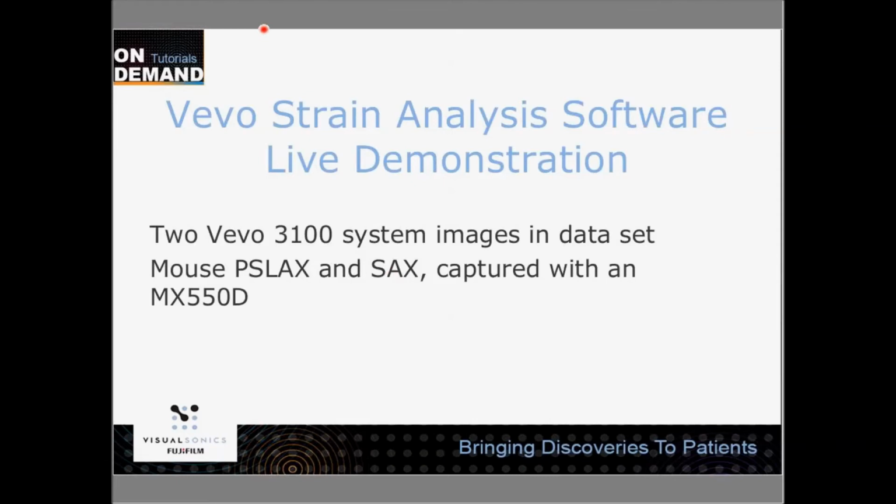If you feel like I'm going too quickly when I'm placing points or anything, just remember you will receive a download link for the recording of this webinar afterwards, which you can then review at your leisure. If you think, oh, he went too fast there and I missed what he did or where he placed those points, you will have the opportunity to review this later on. And also at the end, obviously, we're going to take questions too. So if there's something that you're really stuck on and not sure about, feel free to ask questions, and I can always pop back into the application and just show you.